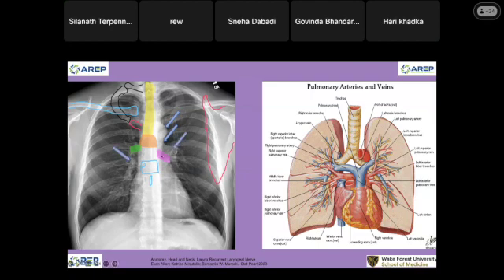Okay, here is our left hilum and our right hilum, as we talked about earlier. For this hilum, there are four structures in there: airways, pulmonary artery, pulmonary vein, and the lymphatic system. They're all together. That one here is upper lobe, middle lobe, and lower lobe.